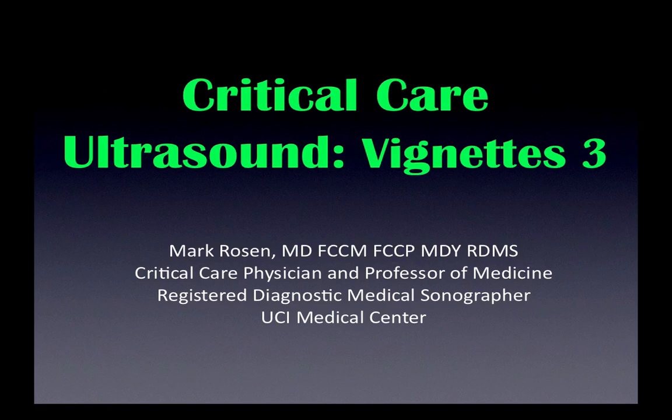This lecture is Critical Care Ultrasound Vignettes, Vignette number 3. Once again, the purpose of these vignettes is to illustrate how ultrasonography can be useful for making clinical decisions and diagnoses in the intensive care unit and the emergency department. Let's look at case number 3.